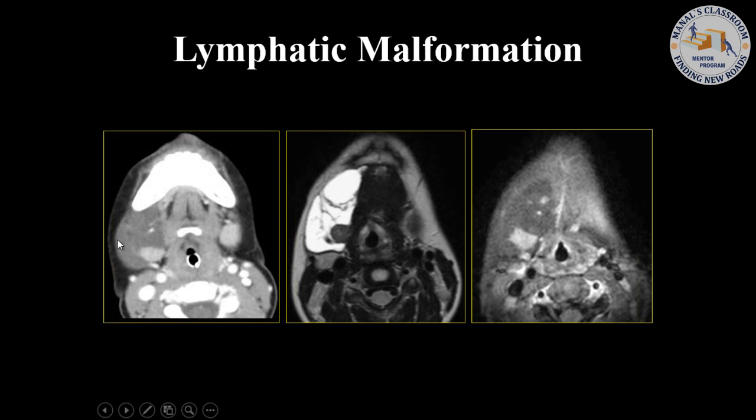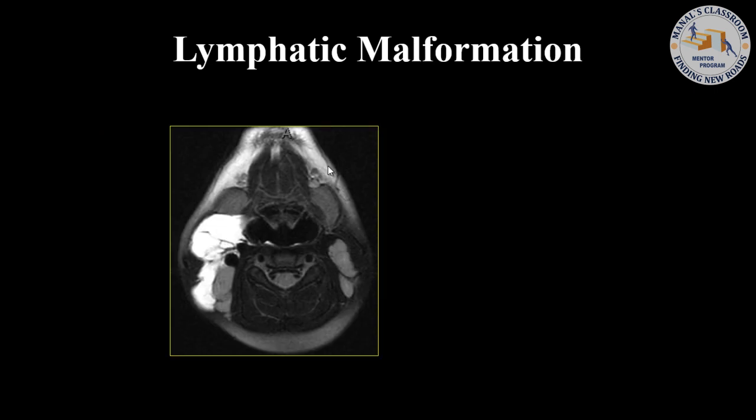Here it's low signal. This is just a part of the submandibular gland that we see on the opposite side. In this case, it's very, very high signal on T2 weighted image. If you want to say that these are very, very large cysts, we could probably postulate that this is a macrocystic lymphatic malformation, but again, I leave that up to pathologists to decide.